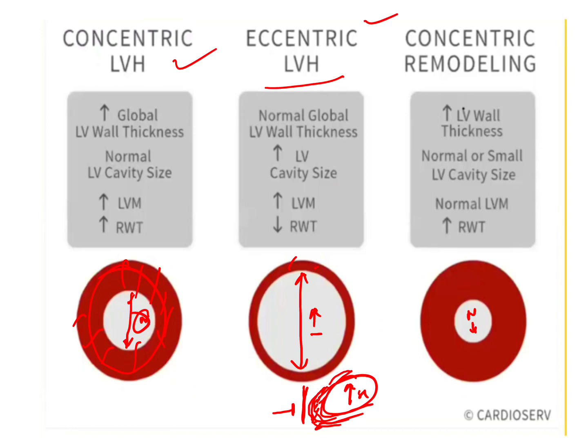in the cavity. Blood is also a good conductor of electric current. So, with the hypertrophy and the increased cavity size, we get deep Q wave in V6. So, whenever there is eccentric LVH with increased cavity, we get deep Q wave besides changes of the left ventricular hypertrophy. The Q waves are not always present, but whenever they are present in V6 with signs of LVH, we must think of cavity potential. That is, it is because of volume overload.